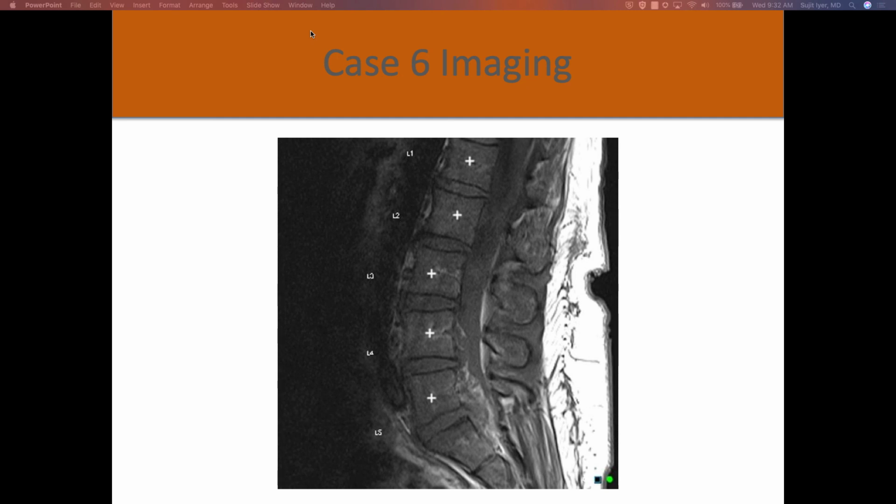So this is a T1 weighted pulse sequence, and the grayish structure is the thecal sac here. And then around the L4 vertebral body level, this is the vertebral body. You can see the body and the vertebral end plates and the disc look intact, but posterior to that body, there's some inhomogeneous signal here, and the thecal sac itself is posteriorly displaced by this process in the ventral epidural space at L4 as well as L5, a little bit S1.